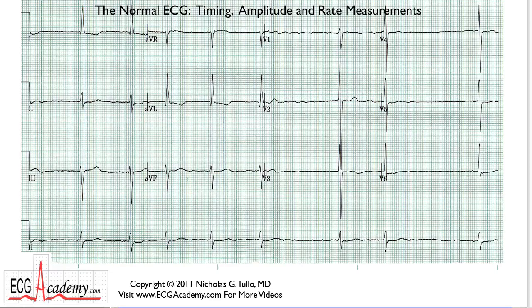the heartbeat is irregular. And you can see some of these intervals are actually very short, and other intervals are very long. And determining heart rate is a little tricky because depending upon which interval you measure, you could get vastly different heart rates. So calipers aren't terribly useful under these circumstances, but I'm going to show you something that is useful.